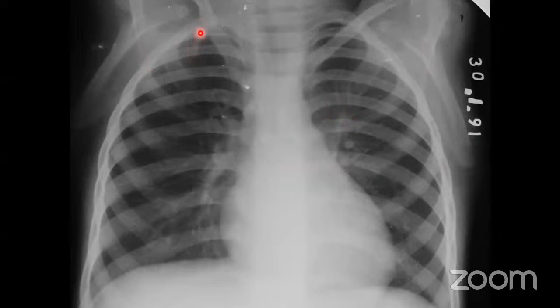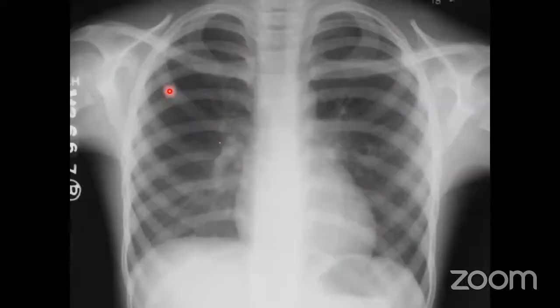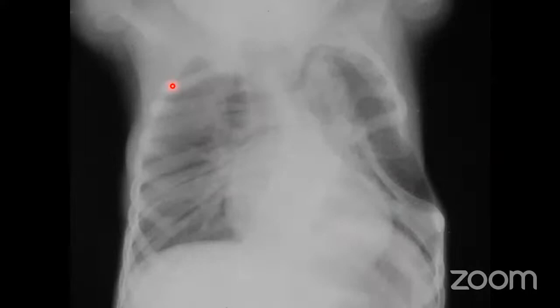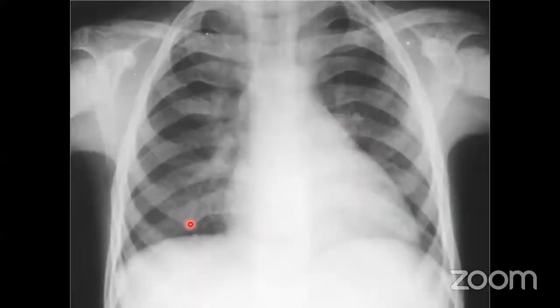This one is the cervical rib, on the right side. And the previous one, which you gave, was a perfectly normal X-ray. The most difficult X-ray that you can interpret is the normal chest X-ray. And here is the cervical rib. What is this? Again, there is a chaotic configuration of these ribs. Some are very thin, some are slender, some are wider, some are missing over here. This is the thoracic dystrophy.